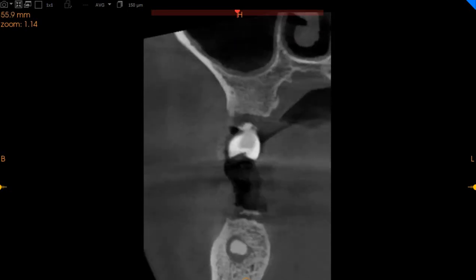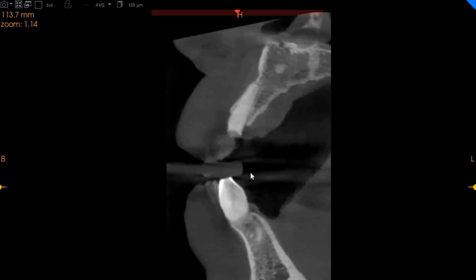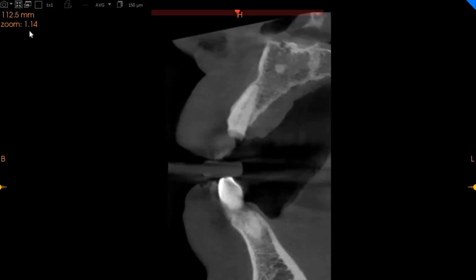Moving to the upper left segment. So this is the upper left lateral incisor. It's a BDR, which you can very clearly see here. The ridge width is 7 millimeters and the ridge height is 24 millimeters. D3 quality bone, and this also can receive an immediate implant.